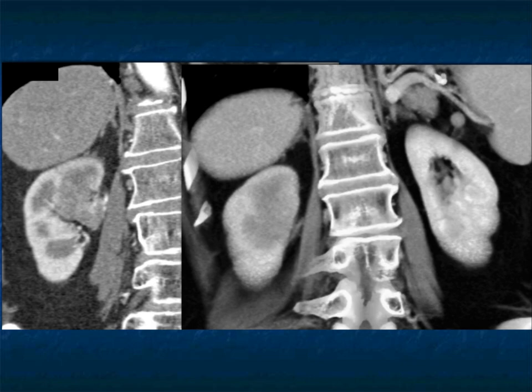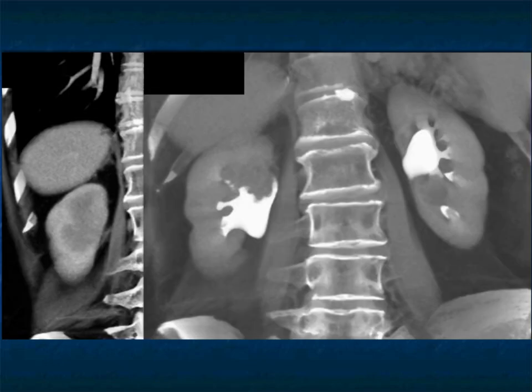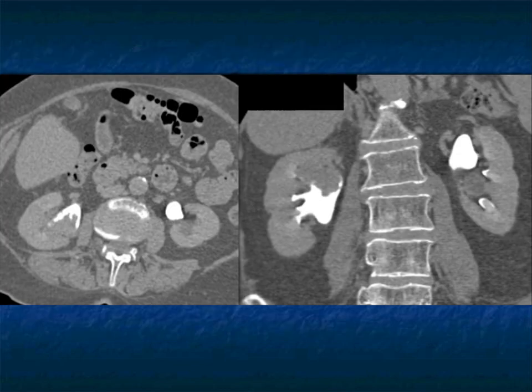Again, lymphoma can give you discrete masses, but not such an infiltrating thing unless it involves the entire kidney. And lymphoma does not tend to involve the calyces. And you see on the excretory phase imaging, look how this mass destroys the renal pelvis and amputates the upper pole calyces. Just a beautiful example of direct extension from an aggressive TCC. So this one is going to have a problem because these are the ones that typically will have additional mets on the patient's ureter or in the bladder, or will recur once they're treated.